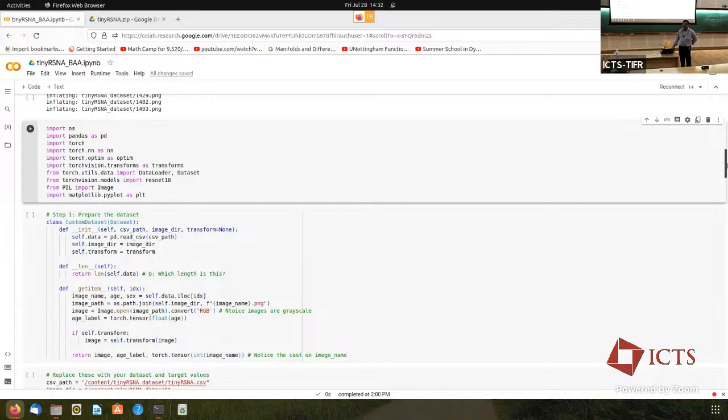I'm doing that because I want to inherit from this class, Dataset. It already has a lot of the things. Otherwise, I would have to implement my own gradient functions in the computational graph. This dataset class is provided by PyTorch. This has to be written down. The format is this. One has to tailor it for the problem at hand.